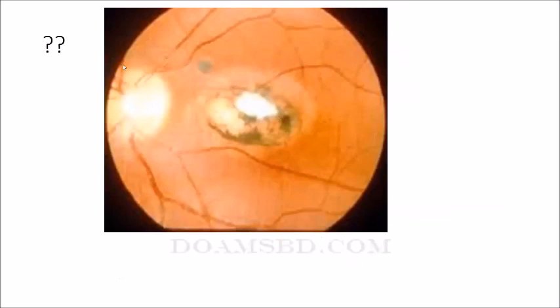Okay. What could be the diagnosis? I think it is easier now. Toxoplasma. I am not asking the etiology. Tell the appearance. A well-known picture for the Part 2 exam, right? In the learning bundles. Should we say this is retinitis or choroiditis or chorioretinitis or optic atrophy? What else? It is chorioretinitis with optic atrophy.